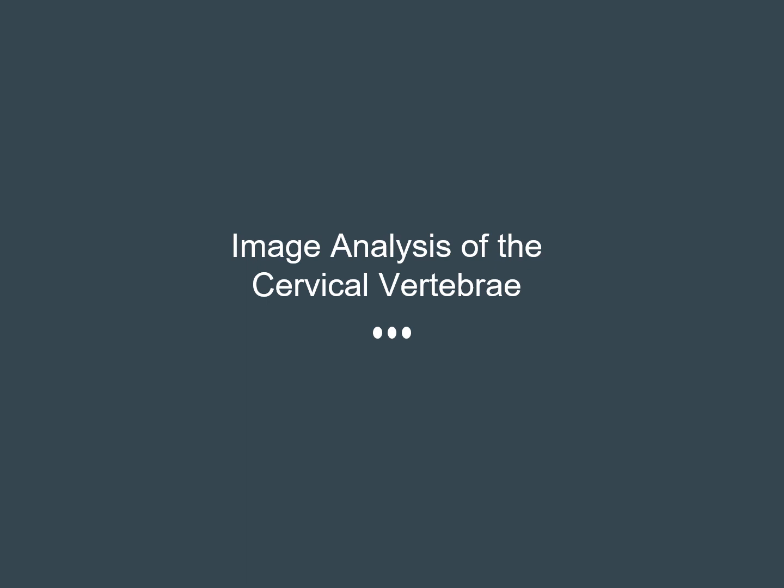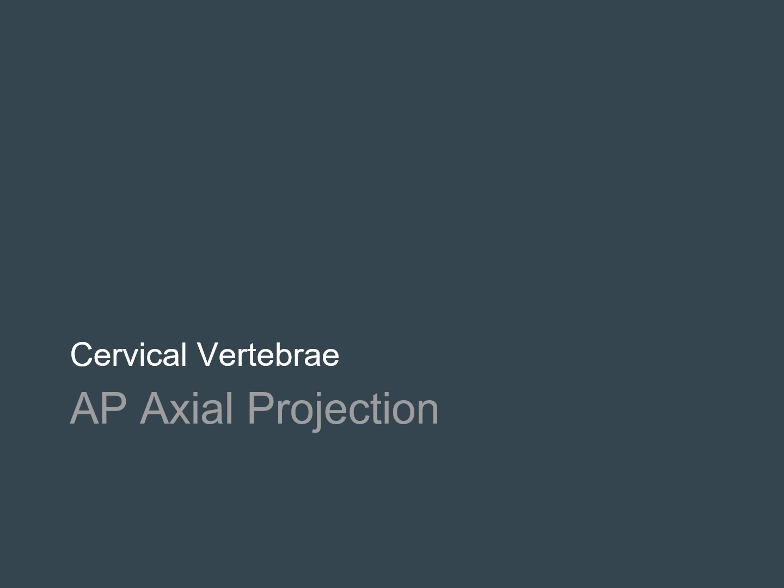In this radiographic image analysis, we will cover the cervical vertebra. Let's begin with the AP axial projection of the cervical vertebra.